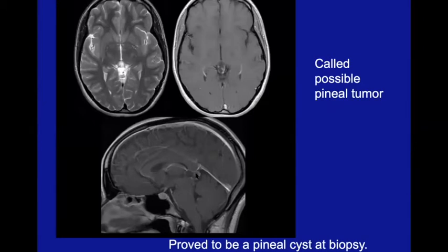The question was raised that this could be a pineocytoma. This actually went on to biopsy. So if you look in the literature, you'll see many series actually are in biopsy-proven pineal cysts. And I hope as people's awareness and sophistication in terms of imaging of pineal cyst increases, that this need for biopsy will reduce as our capabilities with imaging expand.